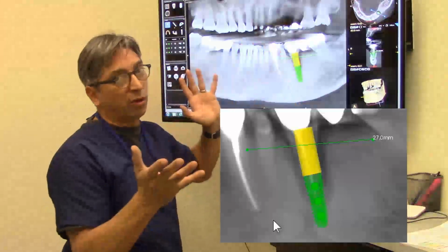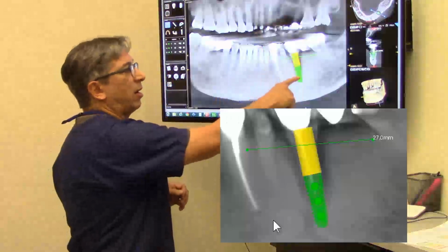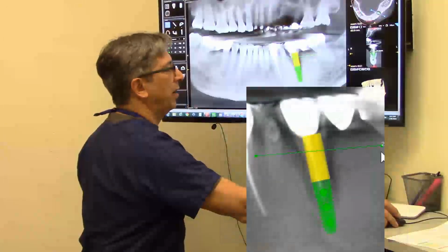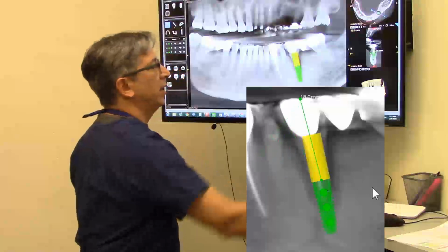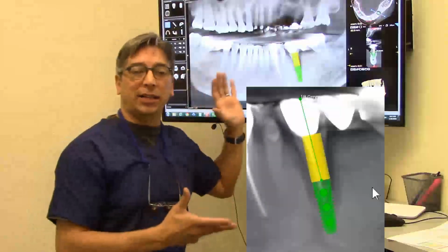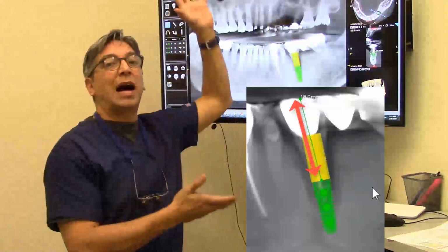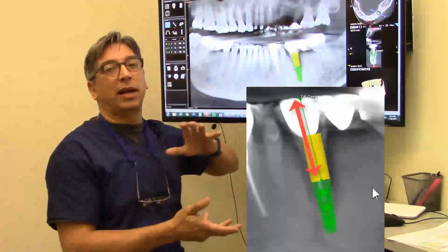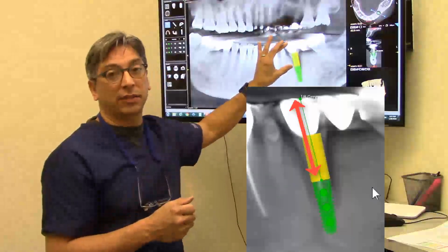And then here's one of our problems. If you put an implant in there, let's say we are at this height. Clearly the height problem is apparent because you have to still make your tooth all the way up there. So this is really a height issue where the prosthetic is just too high of a load for that implant. You have any lateral movement, you're going to crack the mount on something like this if this person's a real grinder.